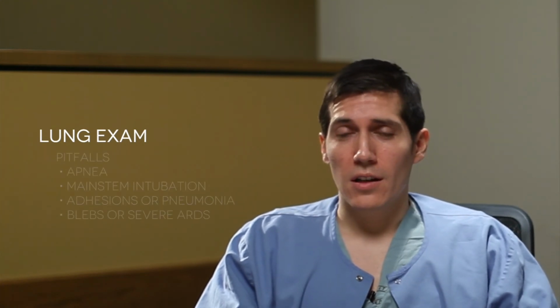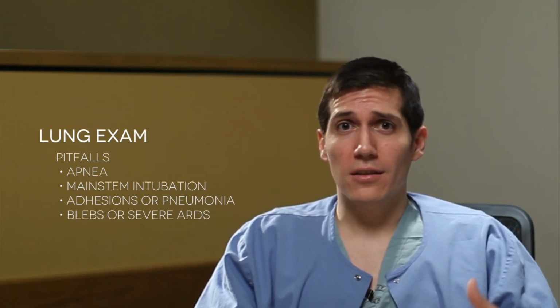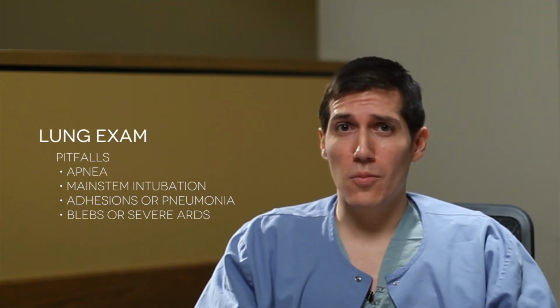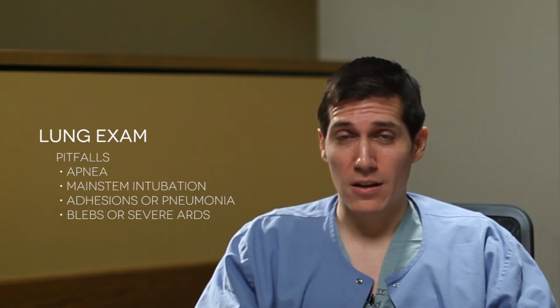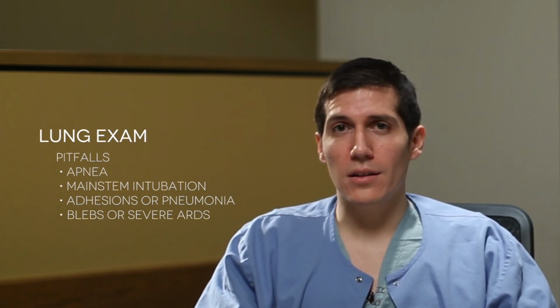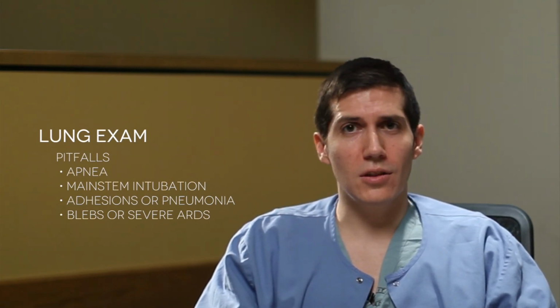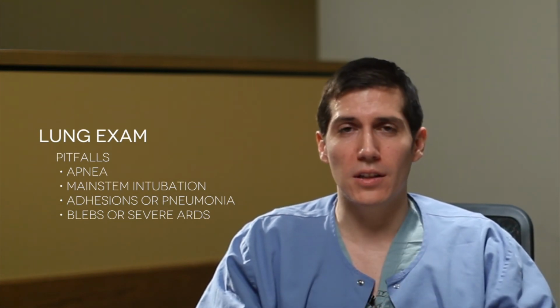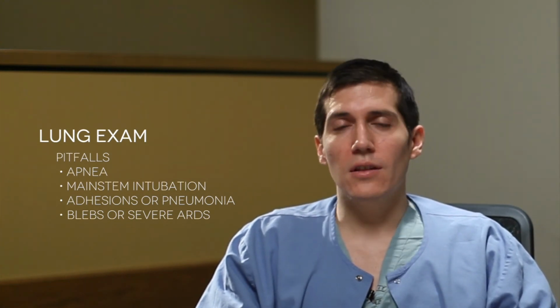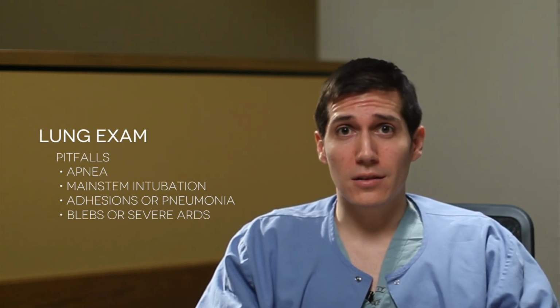Please remember that if the patient is apneic, or if you're checking the left side of the chest and you have a right main stem intubation, you may not have lung sliding present. You may not have lung sliding present if you have adhesions or a pneumonia with consolidation that causes inflammation. So those pleural surfaces will not be rubbing together. You may also see this with blebs as well, or severe ARDS causing similar inflammation.